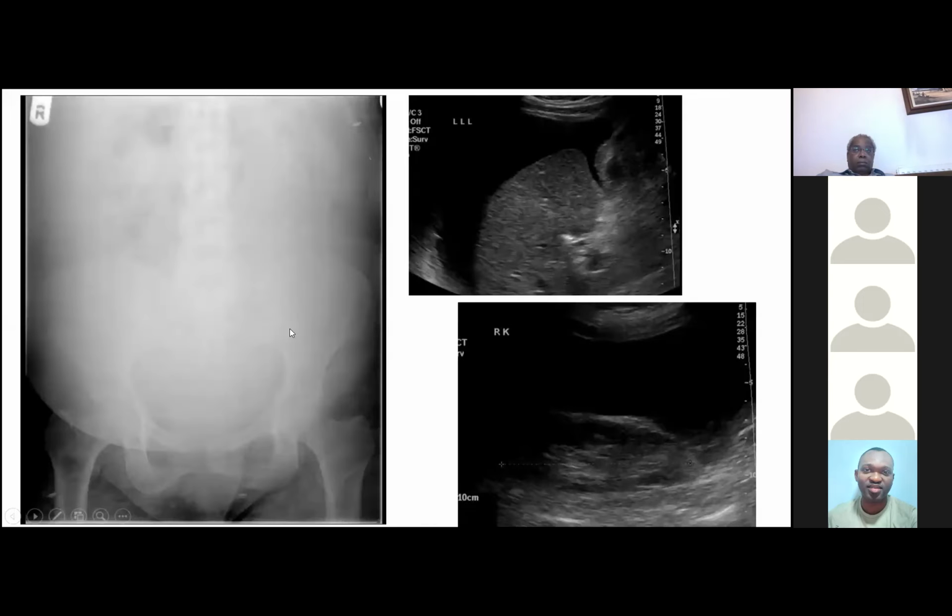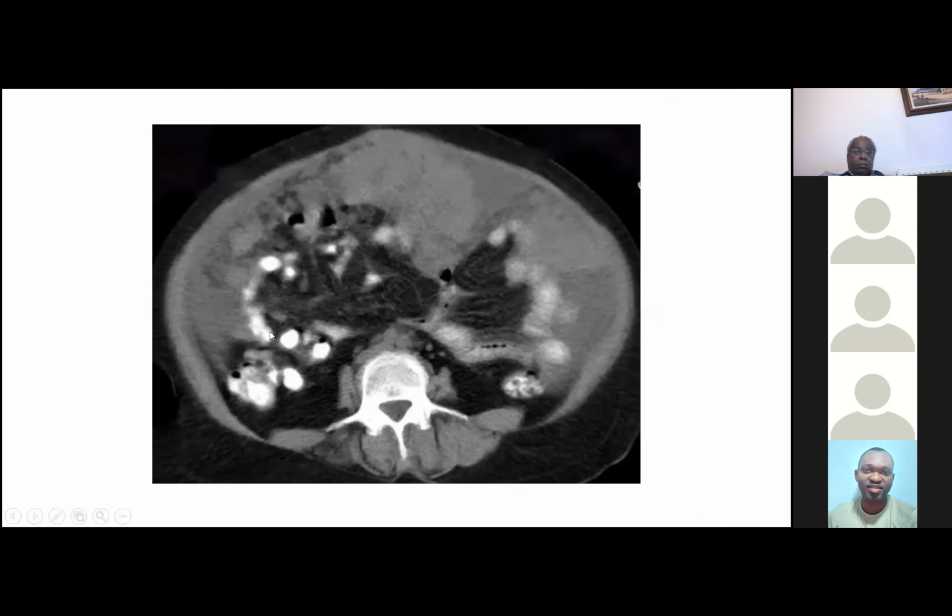The next examination, this was another patient, again, the same finding, ground glass appearance, haziness of the abdomen. It almost looks like quite a poor quality exam, but it's because there's all this free fluid in the peritoneal cavity. This is the ultrasound scan performed, in the image on the right. You can see where the arrow is pointing. There's a large volume of ascites. Again, the image below that, the dark area, the black area, corresponds to ascites. Again, the ultrasound scan wasn't really diagnostic.